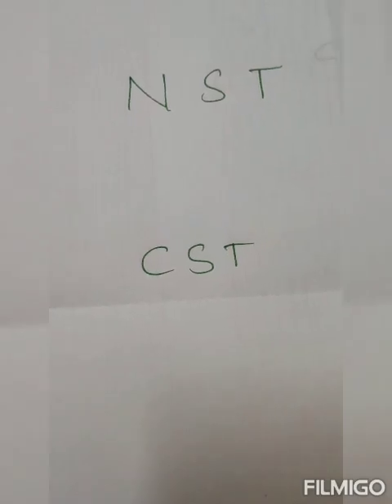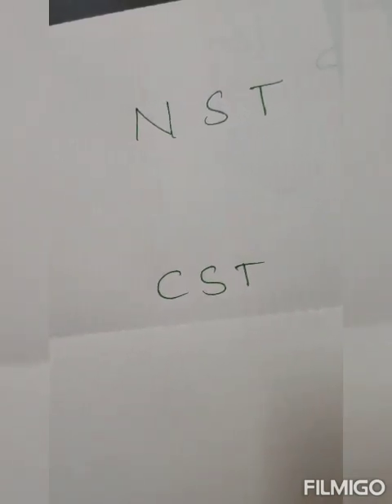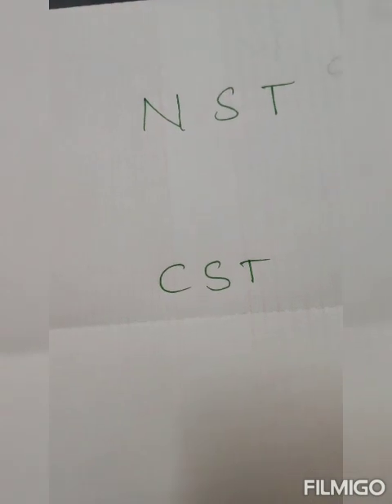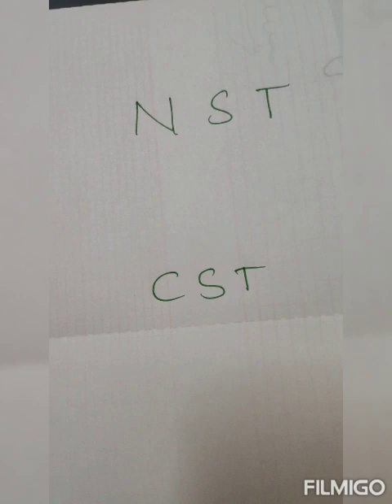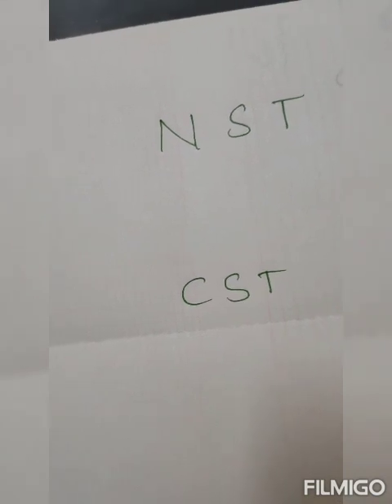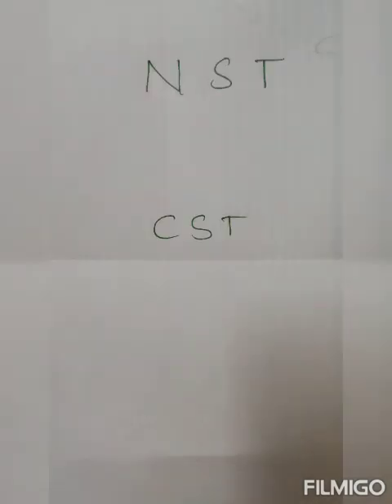NST is the method of antenatal fetal surveillance in which the fetal heart rate monitoring will be done on a graph in the antenatal period when there is no contraction or stress. Hence, it is known as non-stress test. When there will be contractions, or if NST is non-reassuring, then we will do contraction stress test to assess the uteroplacental insufficiency. It will be done by the same machine, but oxytocin will be given or nipple stimulation for uterine contractions.